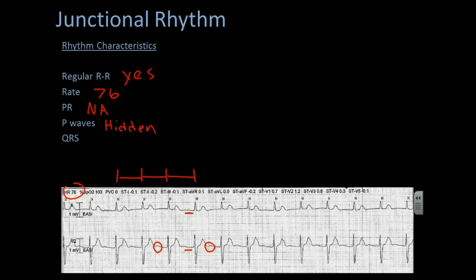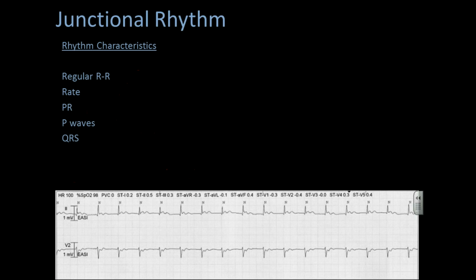All right, let's move on to another real strip. Okay, let's evaluate this one. Let's take a look at it for a second. Okay, R to R intervals look pretty regular to me.